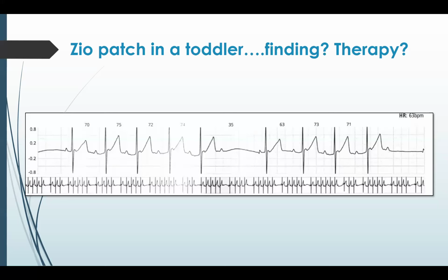So now looking at it more, I'm trying to ascertain which it is. I would say it looks more like Mobitz type 2 AV block. Wait, did you say Mobitz type 2 Wenckebach? Did I hear you saying that? Well, I'm trying to ascertain if it's a Mobitz type 1 Wenckebach, or type 2, and looking at the P wave and the PR interval to see if there's any prolongation before we lose that R wave.